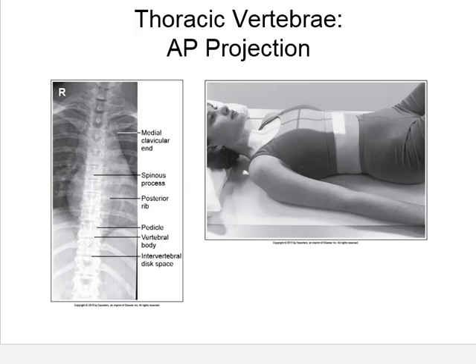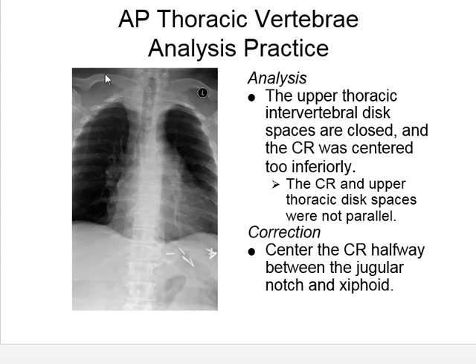So evaluation, again, very similar to a chest x-ray. Look at where these clavicles are. We got way back lordotic. So we've got low positioning, so we're centered on the lower portion of the T-spine and projected the clavicles way up above the apex of the lungs. And we exposed a portion of the patient we don't need to expose, and our result was just an ugly x-ray.